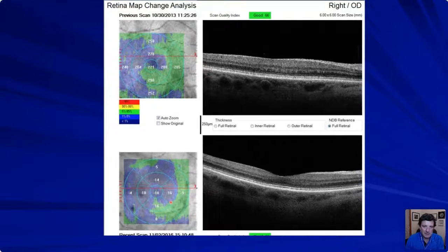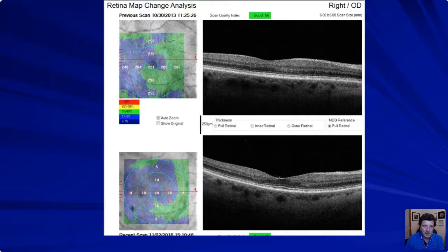Now what I'm going to do is scan down through here, and I'm going to stop right where I am at this scan. See, I'm cutting through here. It's this area out here that you want to try to pick up the Plaquenil toxicity. Look at her scan up here in 2013. Here, see how you can follow this outer nuclear layer? And all of a sudden, it looks like it's starting to become a little bit absent. And look right here. Look how this is dropping down.